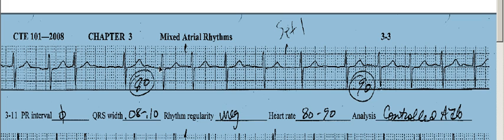Then you take the calipers, measure out a PR here, and look in this space inside of your calipers. Does that space, that line there, look like this line or look like this line? No, they don't. Let's try over here. That's flat over there. I see a lump here, but it's not where I would expect a P wave to be. And on the way through, you know what, guys? There is no P wave here. Okay, I see something here, and I see something here. But again, they're not in the same place. And even though I see these, they're not anywhere else on this strip. So again, I'm hard-pressed to find P waves. So I'm going to say no P waves for right now.